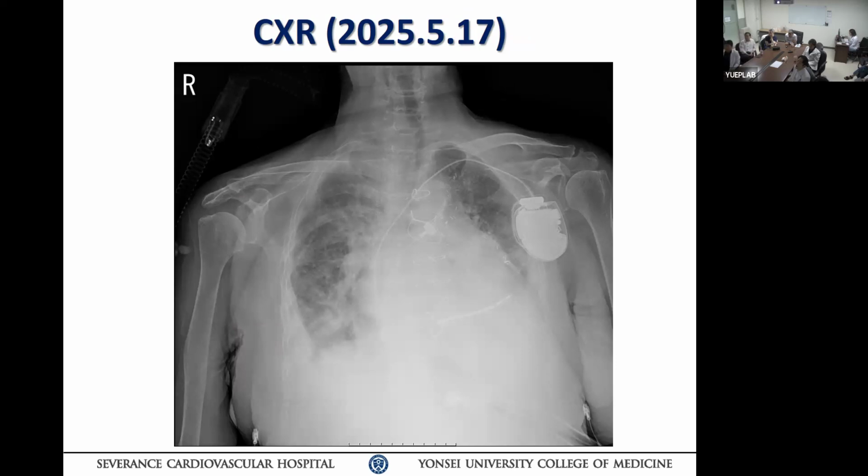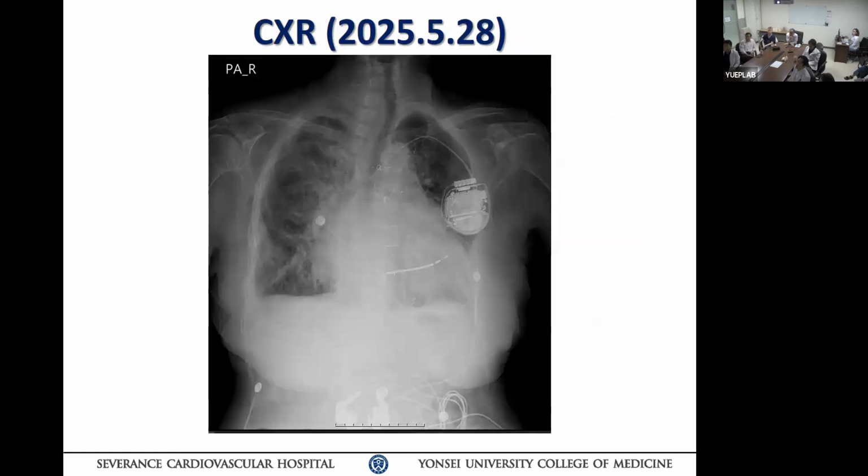First, he came to the hospital. There's a pulmonary edema, yes. You got bilateral pleural effusion, yes. Okay. Much better, but it still has an effusion bilaterally, not resolved. And then you still got a chest atelectasis in the lung here. So you've got to do some more breathing exercises for this woman. She expanded that lung a little bit.